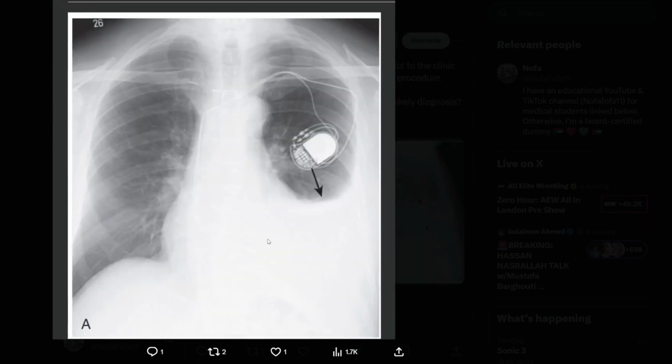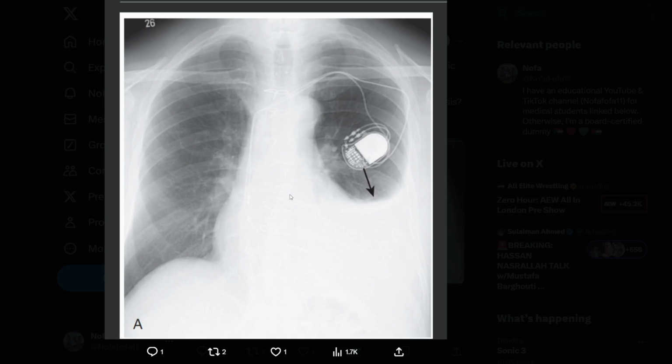So with a left-sided pleural effusion, and maybe more or less a case of cardiomegaly, an enlarged cardiac silhouette, along with this patient's findings of fever and chest pain following a heart procedure, we will assume that this patient has Dressler syndrome, or autoimmune pericarditis. The medical treatment would be, as first line, a high dose of aspirin followed by colchicine to prevent recurrent attacks.